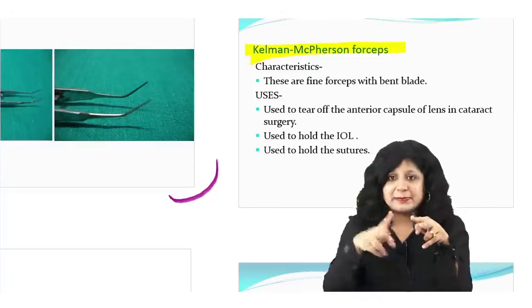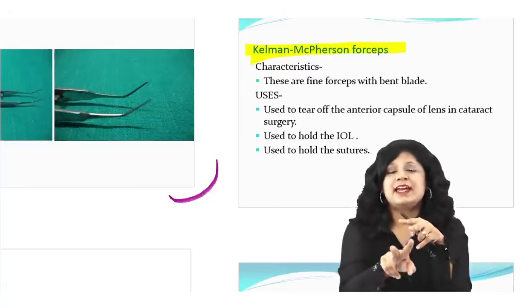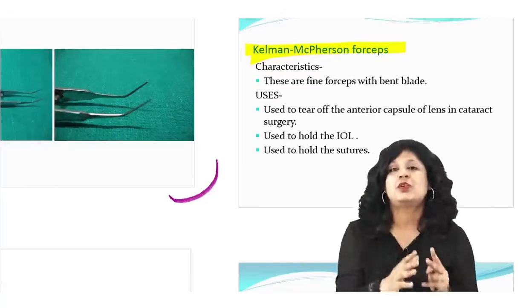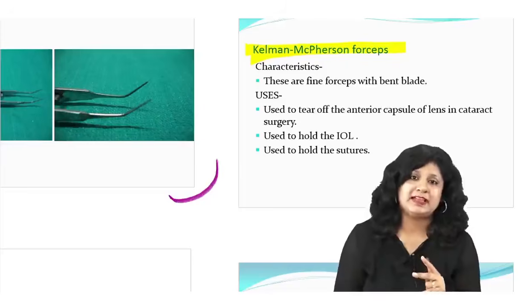So the basic purpose is for suture tying and for holding the IOL to take it inside, but at times you can use it interchangeably. If you do not have the cystitome, then we can use it for the capsulotomy as well, right?